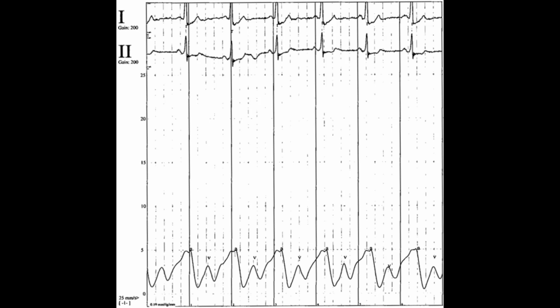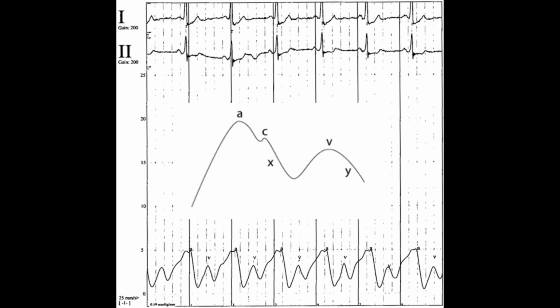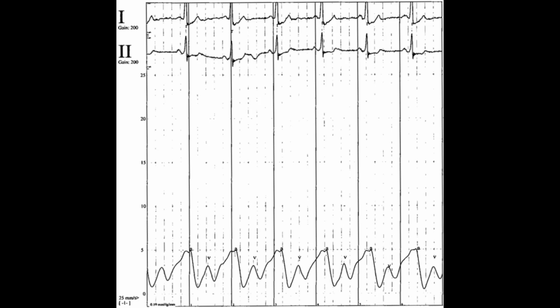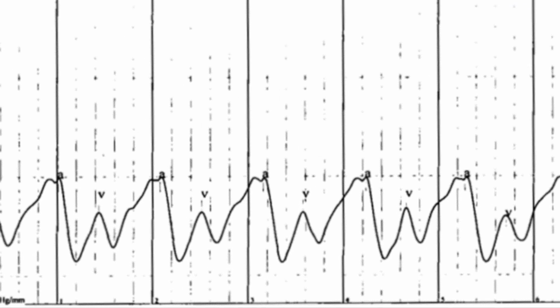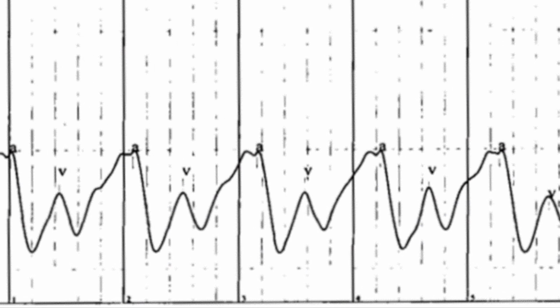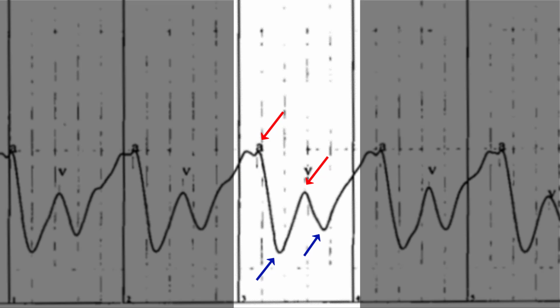In normal physiology, there is a C wave present after the A wave and midway on the X descent. The C wave is a small positive deflection that represents tricuspid valve closure. This is not typically seen in right heart catheterization tracings. Atrial tracings can typically be recognized by the presence of 2 positive and 2 negative waves for each cardiac cycle.